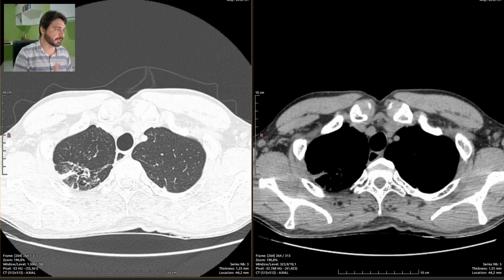Just gonna summarize the report at the end of the report, so the referring doctor is happy when he just skips the entire report and just reads the conclusion, the summary. So everyone is happy.